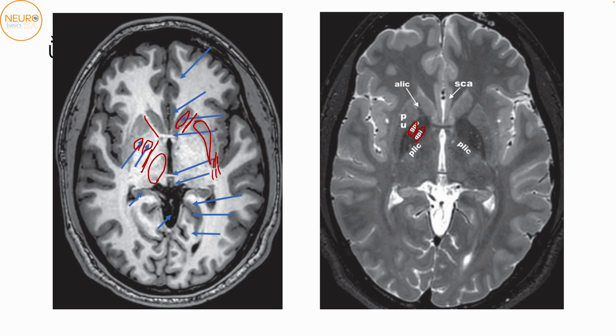This right here is the region of the pulvinar. Apart from that, we are also seeing a very important gray matter structure, which is located along the medial border of the atrium over here. This is the junction of the atrium and the temporal horn. So this is actually the tail of the hippocampus. Behind the tail of the hippocampus, this is the cingulate isthmus, part of the calcarine. This is the lingual gyrus, and then you have the cuneus over here. Same thing: this is the calcarine, this is the cingulate, this is the lingual, and then you have the hippocampal tail over here.